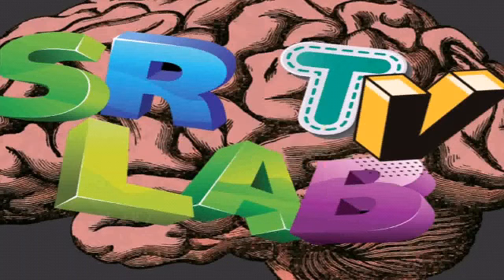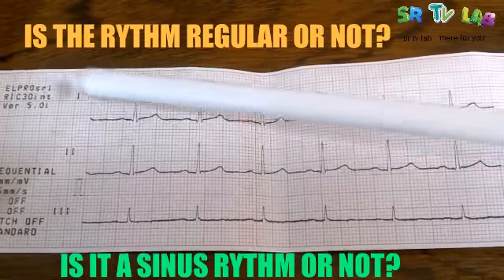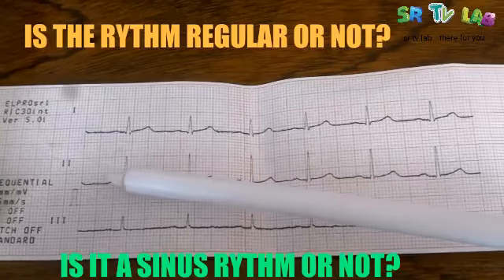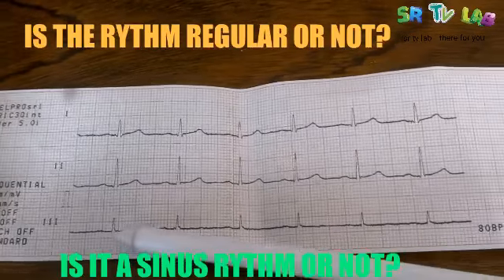So guys, this is how the electrocardiogram looks. Remember, in ECG we have 12 leads. This is the tracing for lead 1, tracing for lead 2, this is for lead 3. Remember, these are 3 bipolar limb leads: lead 1, lead 2, and lead 3.